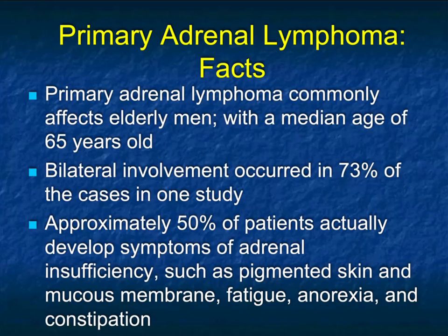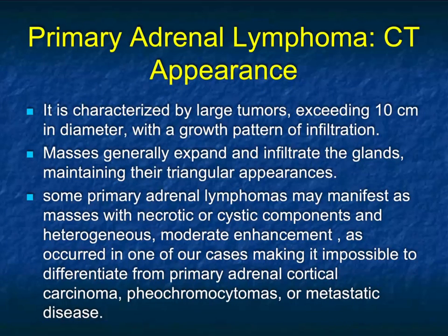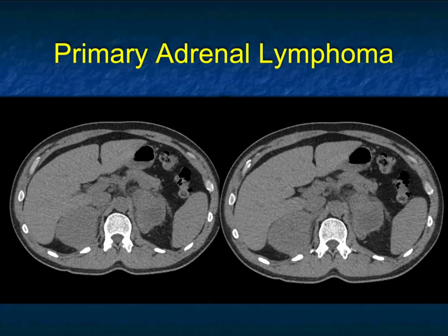We talk about other tumors, primary adrenal lymphoma. We recently wrote an article about that. Usually bilateral, usually very large. It's homogeneous in enhancement. It's adrenal shaped, but it's not very, very vascular. And again, we talk about adrenal lymphoma as part of a multi-organ process. The cases here are part of a primary adrenal lymphoma, where it's the only site of disease. Kind of an interesting case.